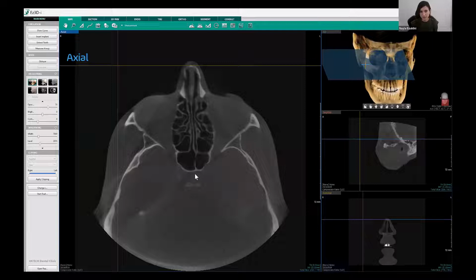So it houses the pituitary gland. It's always important, especially on a sagittal view where you can actually see all of its outlines, to make sure that there is no enlargement or destruction of any of the cortical outlines. Now, bilaterally to the sella turcica is where we usually can identify or view any internal carotid calcifications.